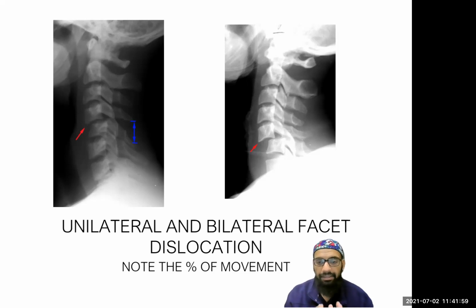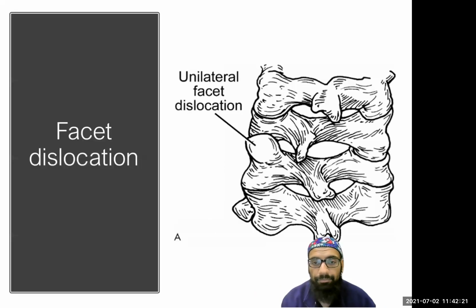Now, in our case, these patients are at high risk for neurological deficit, paralysis, and of course, what do you call it, neurogenic shock. So that's why you've got to manage these patients quite aggressively. Okay. So you place them in a hard collar, C-spine, CT, you can include a brain CT, and orthopedic management as soon as possible. Okay, so we've already covered what the facets look like.